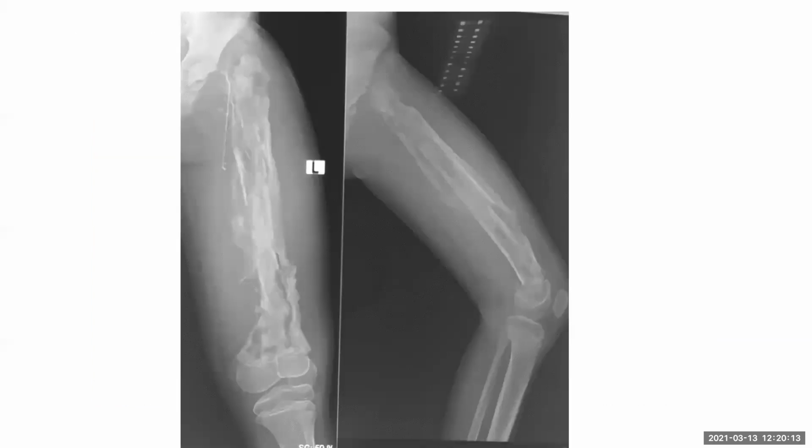Okay, this is osteomyelitis. The whole bone is involved. You can see this nail as well. There was a subcapital fracture, which caused the displacement of the bone towards the upper outer side. This was a nail which was displaced because of the osteomyelitis and the bone being soft. And this is all involucrum, the dead bone, the sequestra, and this is the cloaca formation over there. And you can see that the fat planes are blurred, which happens in infections.